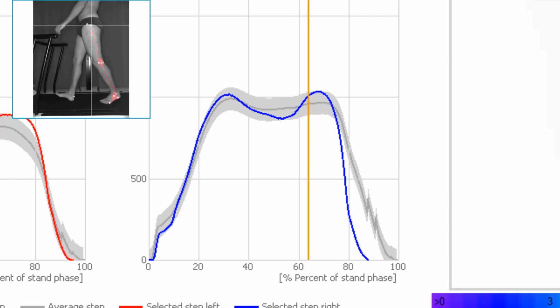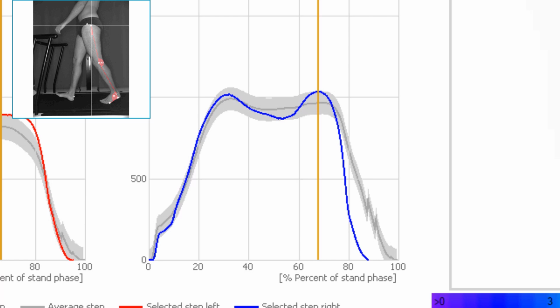Did you know that at this point the force development of the plantar flexors increases to a level of up to 85% of their maximum voluntary contractile capacity? This is also the cornerstone for a wide range of gait deviations, since in today's sedentary era we often see the tendency for the retrotibial muscles to weaken.